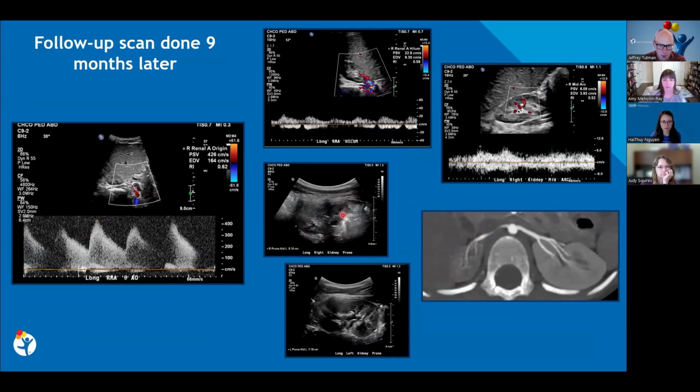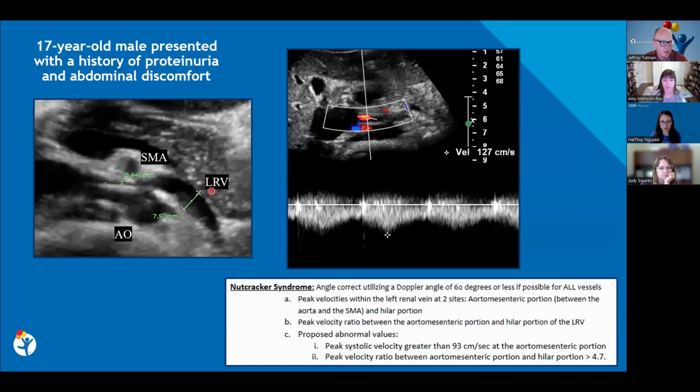So the right kidney was getting more atrophic. Then on CTA, you can see this tight stenosis within the main renal artery. And then you can kind of see this differential perfusion. So I just wanted to share a more typical positive case of renal artery stenosis.